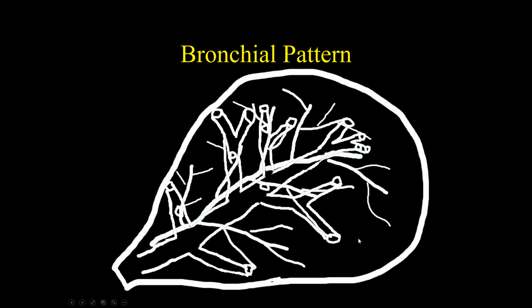If you have the same one with bronchi, now we have big, thick-walled bronchi because of dilated bronchi and airways in the periphery of the lung. So we start to see end-on donuts in the periphery of the lung, and leading up to those donuts, you'll see these little tram lines if you happen to see them in longitudinal section in the plane of the film. Okay, so what we see with the bronchial pattern is thick-walled bronchi or donuts in the periphery of the lung. If we see them up here in the perihilar region, that's normal, so that doesn't count.